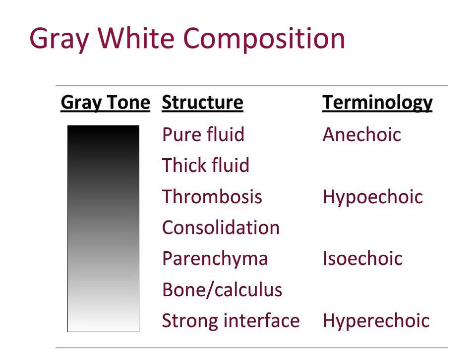So what happens to ultrasound when it hits air? You get A-lines. This known air artifact is used in lung ultrasound, where you see multiple horizontal lines deep to the pleural line representing reverberations of completely reflected sound between the skin surface and pleural line. Typically, you cannot see past air.